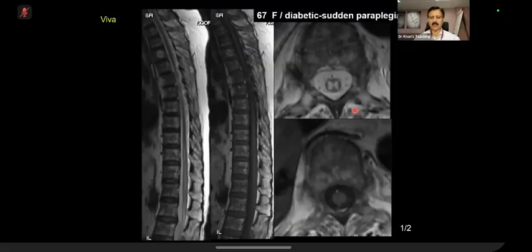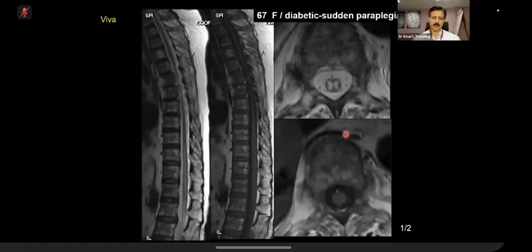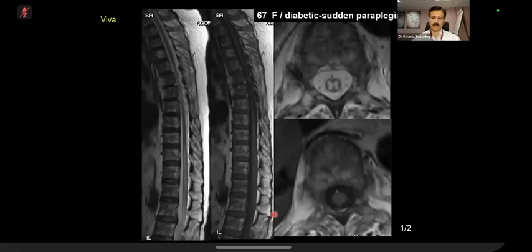Because the patient is diabetic, they're probably vasculopathic, so I'm going to hazard a guess that this could be a kind of ischemic event. You are right, but I want you to be very specific, very confident. There's a pattern here. Think anatomy. That's the hint from my side.